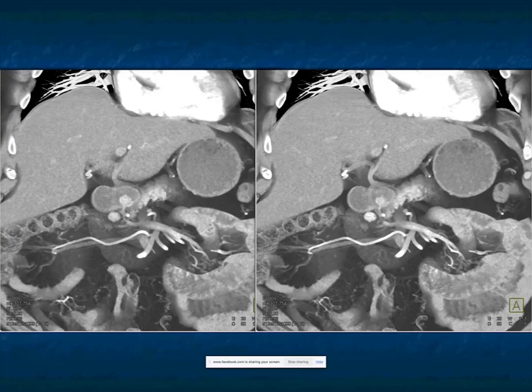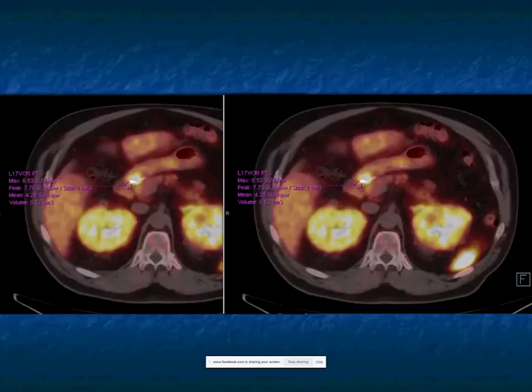So you got to be thinking of a neuroendocrine tumor. You can think of a gastrinoma based on location, but a neuroendocrine tumor with a node would be a great possibility. What else could it be? You're not going to say an ectopic pancreas because it would not explain the extragastric process. It's not a carcinoma. It's not a GIST tumor.